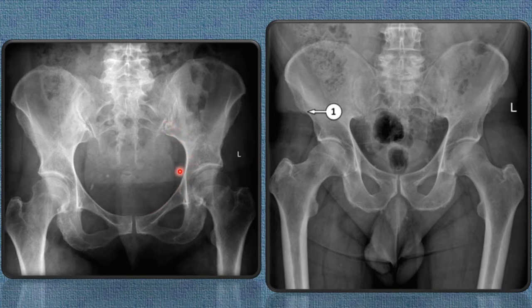This is the iliopectineal line, right? And again, these are all structures we have already discussed, right? This is the trochanteric fossa, right? And you can see a difference in these two. What is the difference? This is a wider pelvis, this is a comparatively narrow pelvis.